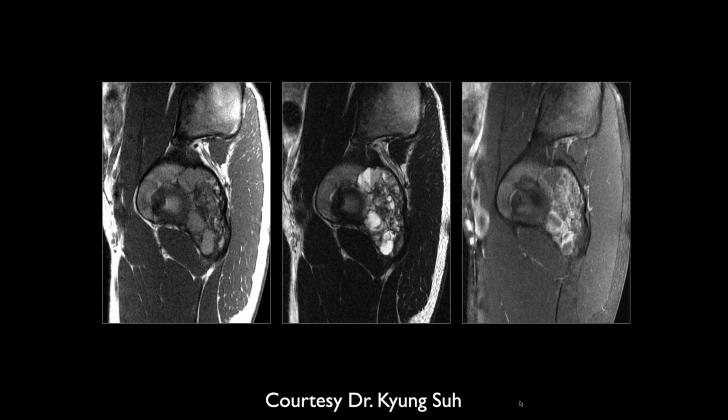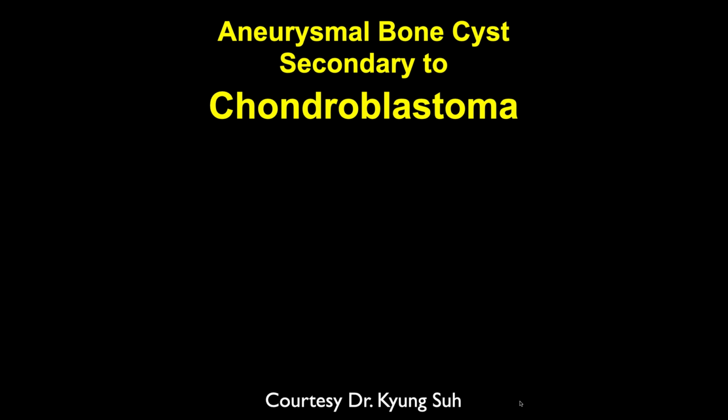And so we've already learned that just because you have fluid levels, it can be a lot of things. I guess it could be, again, another aneurysmal bone cyst. It doesn't look as aggressive, but you used to say telangiectatic osteosarcoma was what you always thought of in the past. Yeah, you tend not to get as much bone expansion with that. Yeah, and it'd be just more destructive. So this is an aneurysmal bone cyst.